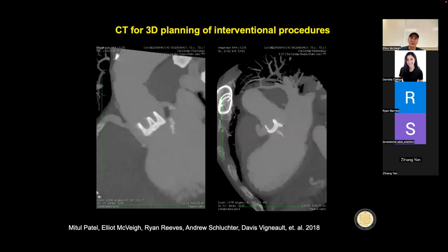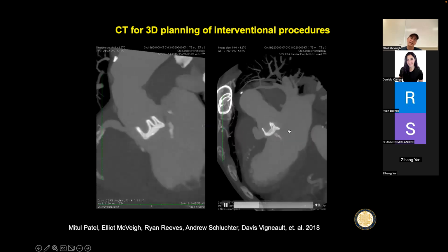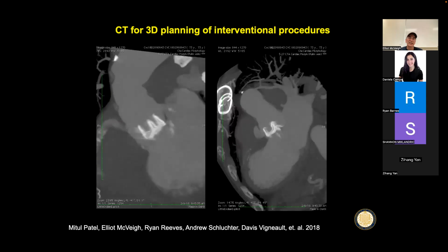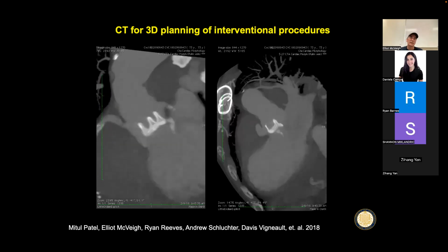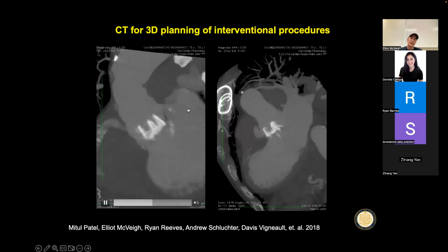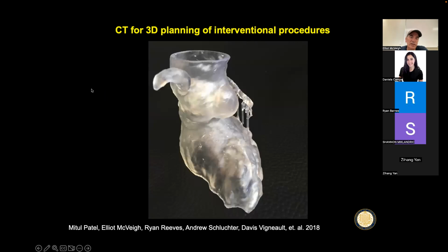So what we did was, here's the movie, right? You can see there's this massive gap here, and a massive gap back here. Probably what happened is the tissue was not strong enough to hold the stitches, and they just came out. Normally this valve is stitched to the patient's valve ring, so it probably just pulled off here. So with this patient, we segmented out the valve and the blood and made a 3D model of that. And it looked like this.